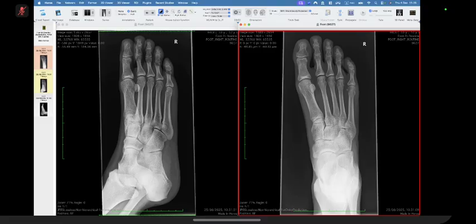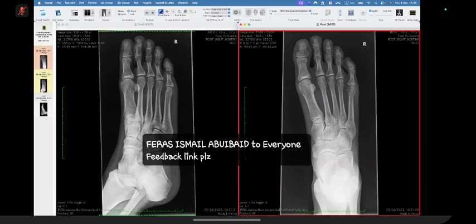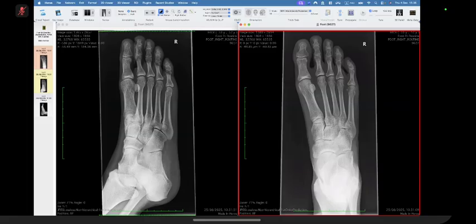In terms of management plan, I would write, if there is no known history of myeloma or METs, whole body MRI to confirm and to visualize the extent of disease. For metastatic disease, you can say unless there's a known primary, you would still recommend a CT chest abdomen pelvis to determine the extent of disease and to find a primary site. That's the way I would word it. But myeloma would be the top differential, followed by METs and followed by hyperparathyroidism. All right, thank you so much.